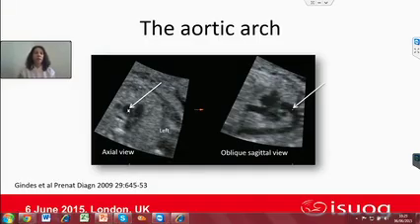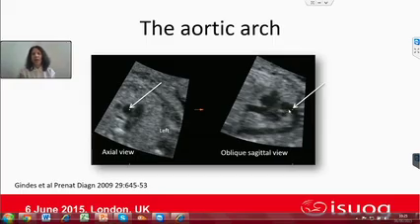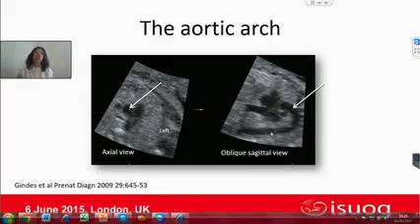If we want to see in the B plane, the sagittal plane, of the aortic arch, we have to put the dot of interest in the aorta, wherever you like, and we have to align the ascending and descending aorta along the y-axis. In this way, we can see the aortic arch here, as you can see, very nicely.